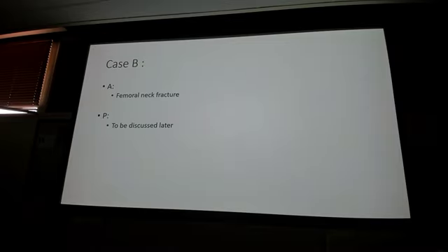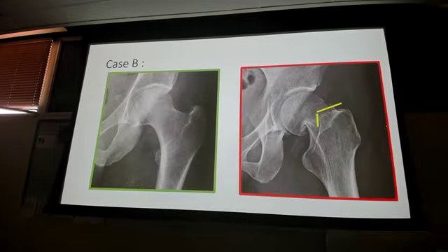Did you guys see the femoral neck fracture? They may not see it. You want to point it out if you didn't. Okay? How do we find that? You can do your stepwise process, or again, knowing what normal looks like will make abnormal stand out.